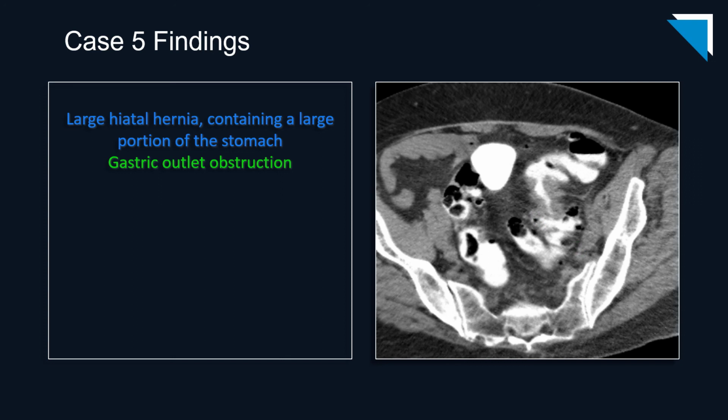However, the patient has another even more important finding in the sigmoid colon. There is irregular localized colonic wall thickening with associated luminal narrowing, which is the classic imaging appearance of colon cancer. I think it's easy to see how one could miss this finding after identifying and describing the gastric outlet obstruction, particularly given the patient's clinical history, but if you religiously employ your search pattern, you are much less likely to do so.